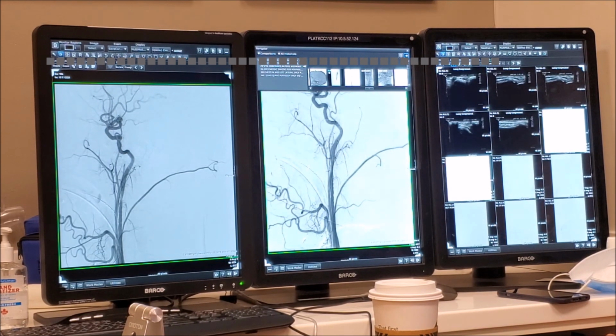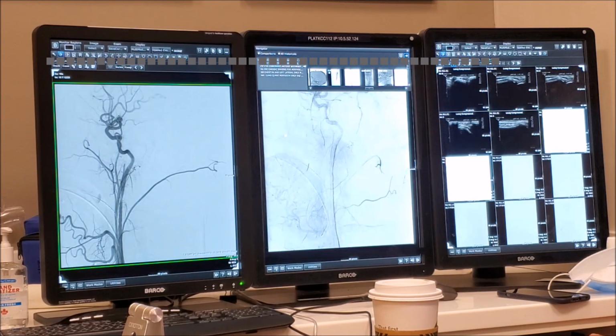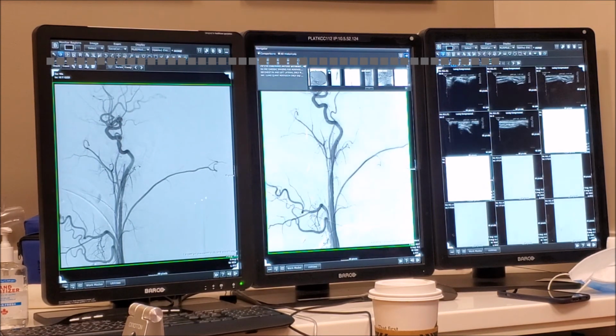And what is this one here? Gee, did you see this case? Yeah, it's very interesting. Very peculiar.